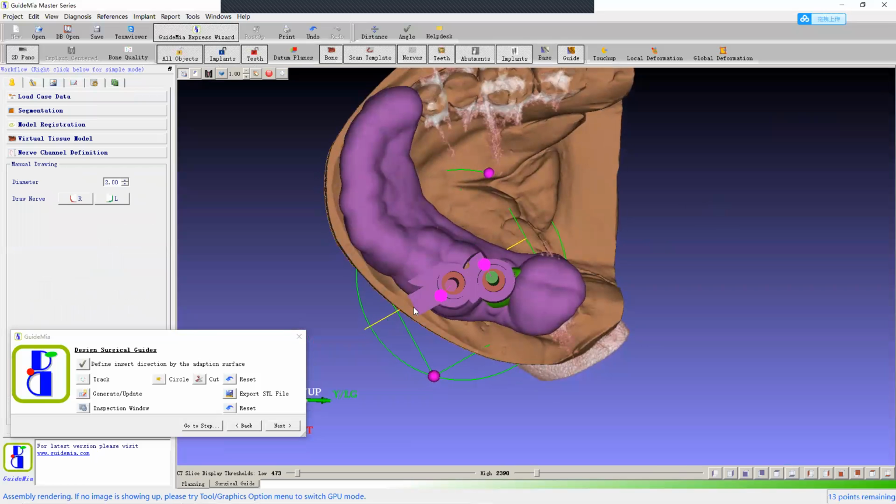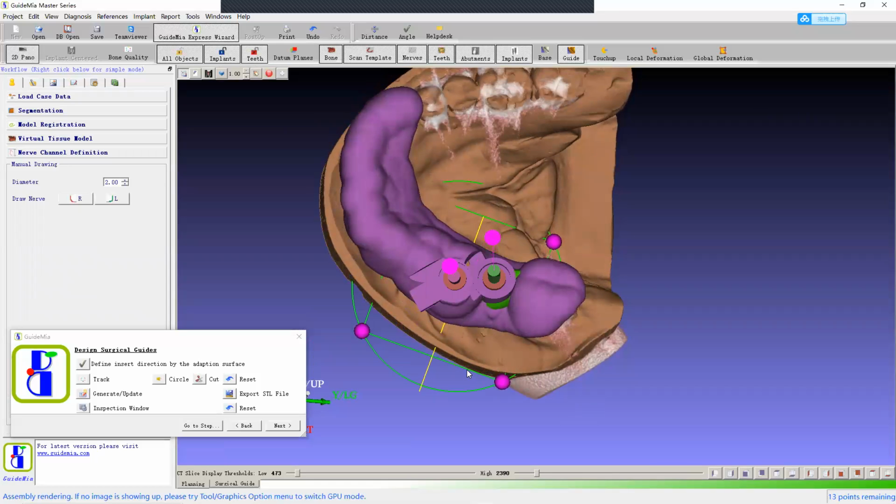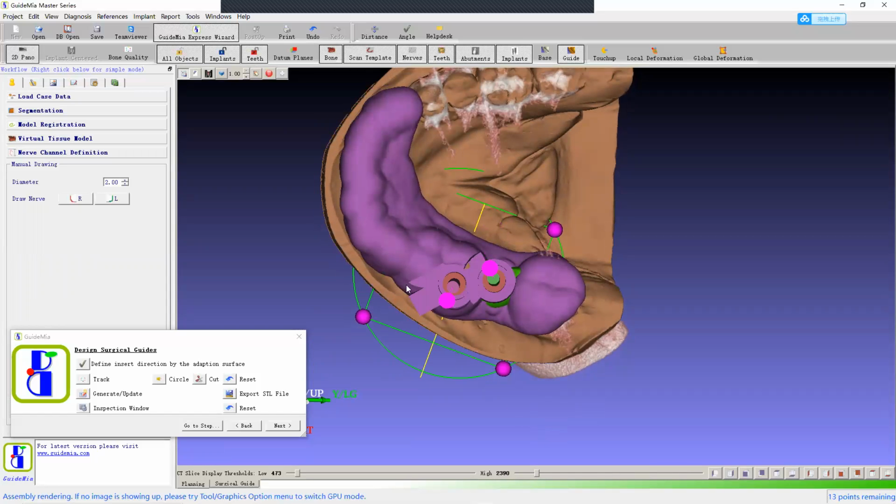Look at this material, this rectangle we added, right? And look at this yellow line. They follow each other. So for the implant placement, if you look at this tool, it has a circle, a square, and this yellow line. On one side is longer, on one side is shorter. So supposedly this yellow line is for the hex orientation of the implant, and for the timing, right? And also for immediate tooth extraction, it's for the orientation to add this material.